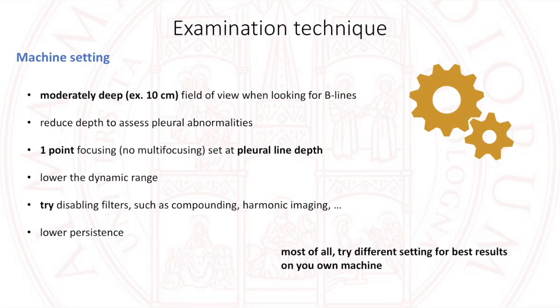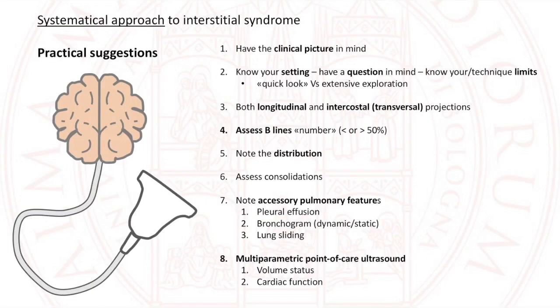But the bottom line is that you have to try all these different settings because the machines can differ, and so try by yourself what works best for you.